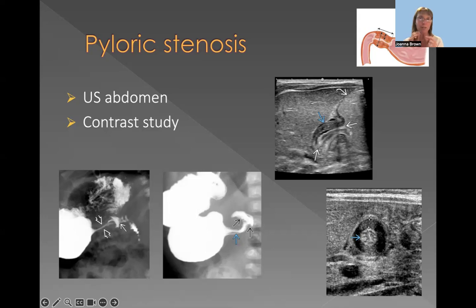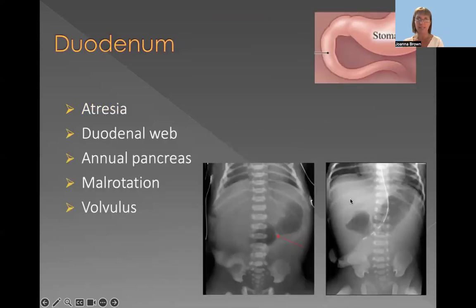And for people who are doing ultrasound of the small bowel, you can see all of the levels always. So for example, here you can see the muscularis in the central part, and this is always the black, it is the muscles, and this is very dilated and hypertrophied muscles.